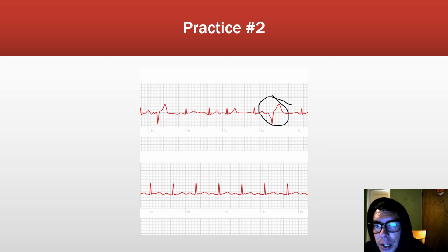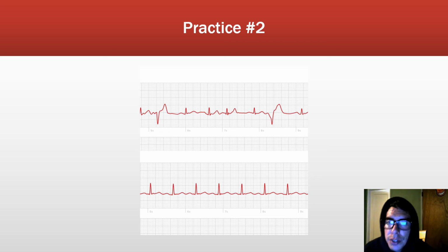After an ectopic beat, there's usually a little pause before it resumes. So we can't use this one directly after to determine regularity. We have to go to the next one, which actually looks a little bit early. So it's hard to tell if it's just an irregular rhythm or whether this too is an ectopic beat.